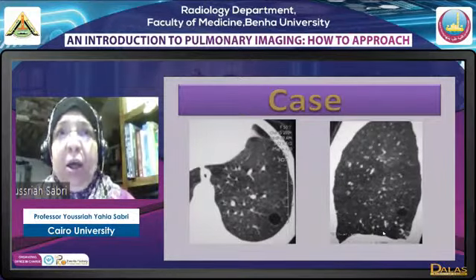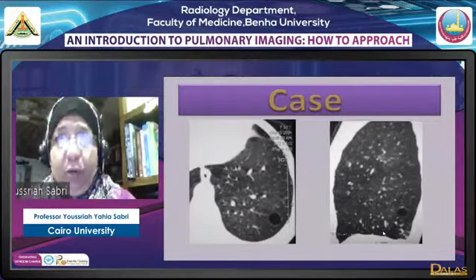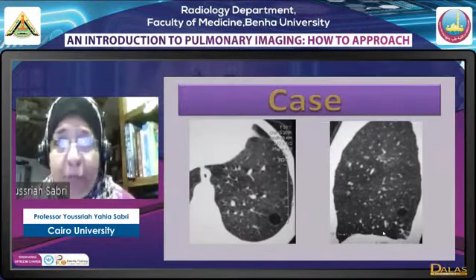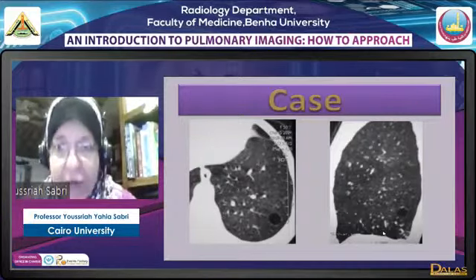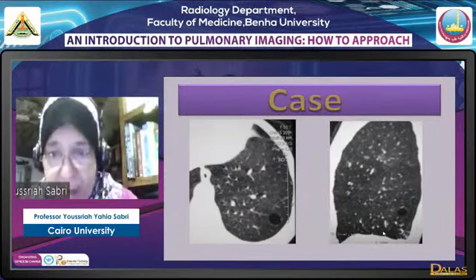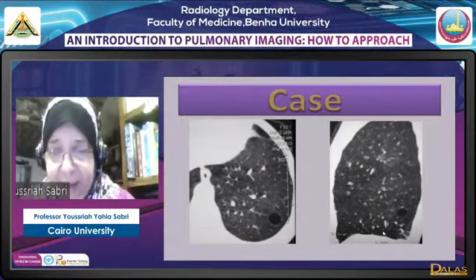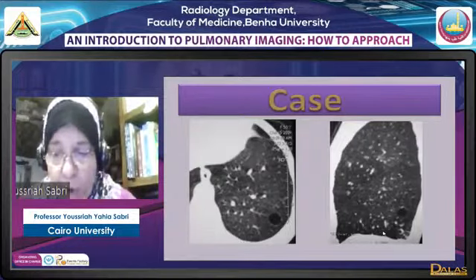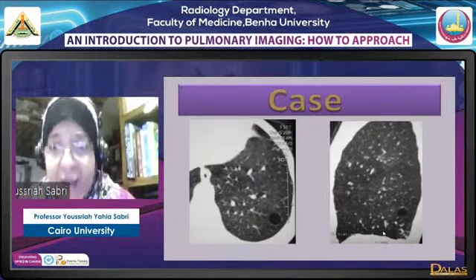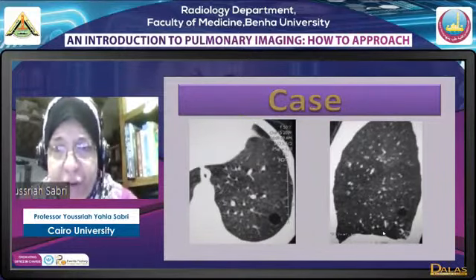What is the possibility? Well, actually, there are congenital causes, traumatic causes, inflammatory causes. There are so many causes. Unless you have a definite history or previous film, this is just an air-containing cyst. You measure it, and you say, where is this? Could the lung's air-containing cyst be congenital? Yes. A bronchogenic cyst in 15% of cases can be a solitary lung cyst, and it will be air-containing, not like the mediastinum where it is fluid-containing. Okay? So it could be congenital. A bronchogenic cyst could be congenital.